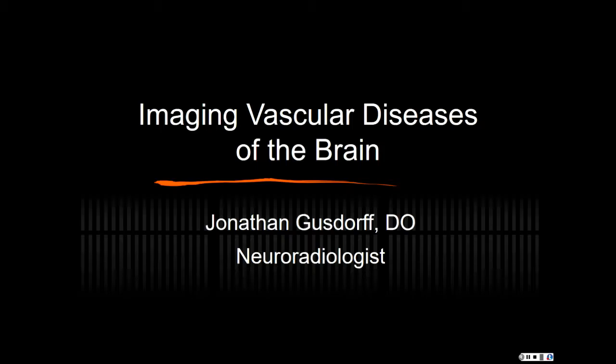If we suspect somebody has acute ischemia, we look at FLAIR. We look at all the images, but I look at FLAIR first. I then go to the diffusion-weighted imaging images. If there's nothing bright showing up on diffusion-weighted imaging, there is no acute to early subacute ischemia.